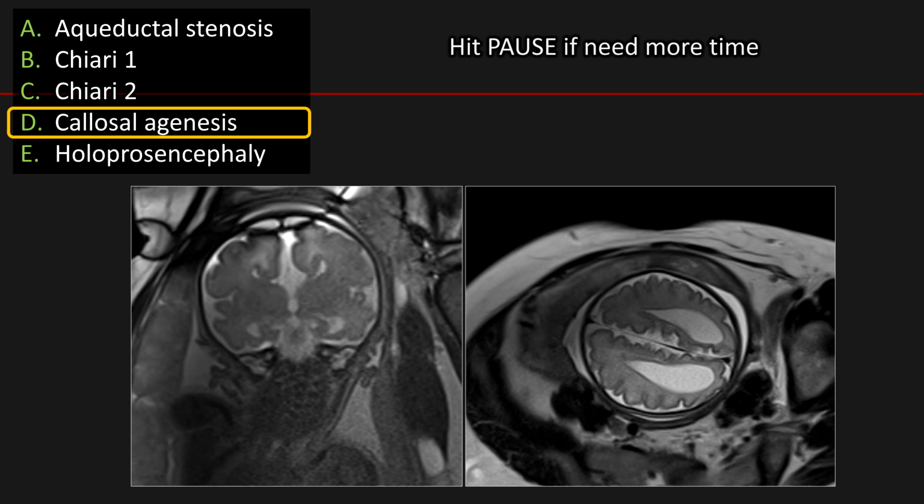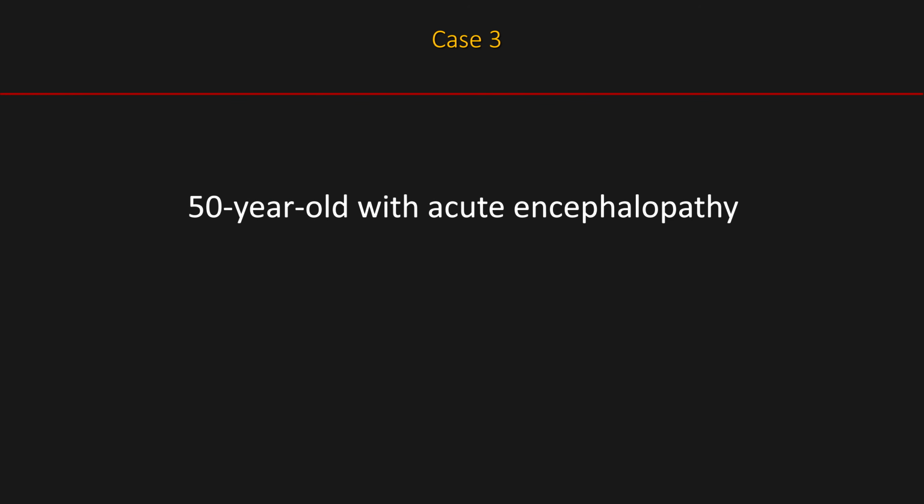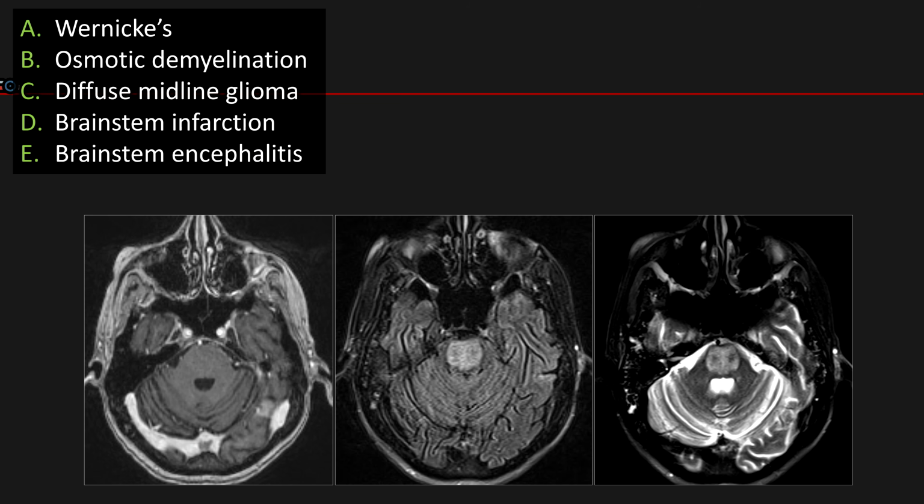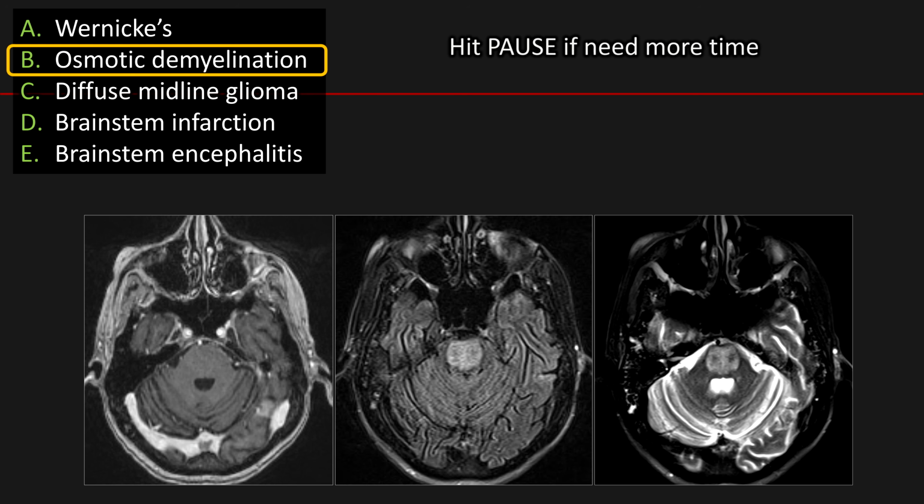This is agenesis of corpus callosum. Case 3. This is osmotic demyelination syndrome.